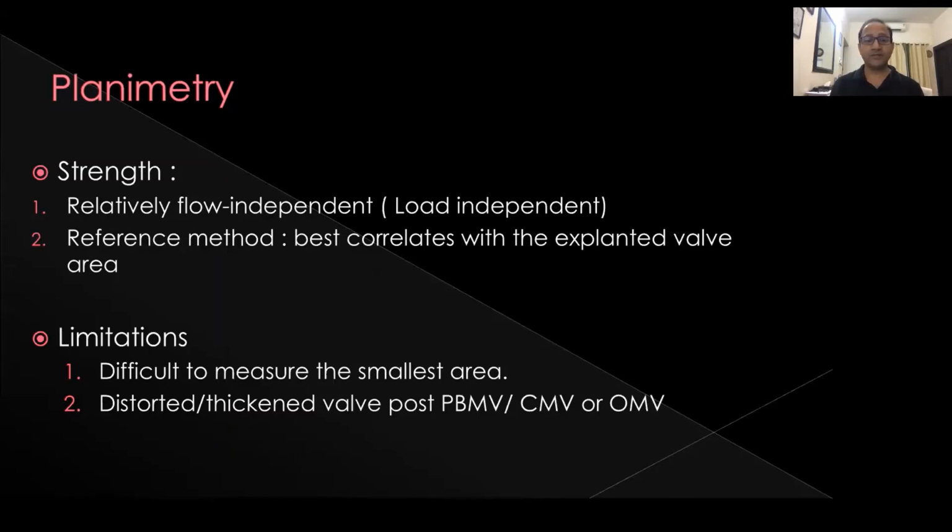The limitation is that it is difficult to measure the small area. You have to spend time and go up to the tips, make sure that you're cutting the tips not obliquely, but as much aligned as you can. And if there is a lot of distorted, thickened valve, then you are likely to make mistakes, or it's not going to be that accurate. And of course, post BMV, this is the only way you can use. Planimetry is the only way to assess the severity or the success of BMV.